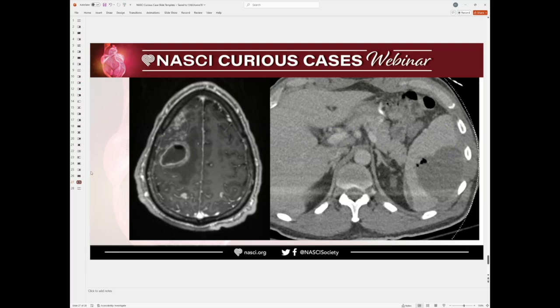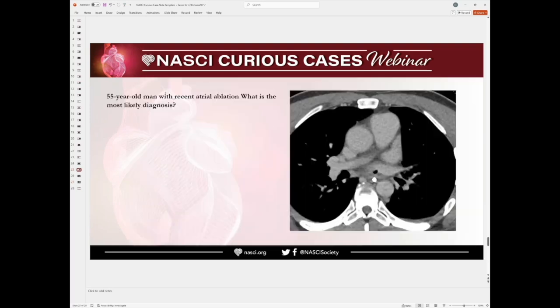Unfortunately, in this case on chest CT, they never gave us any history of ablation or anything. When you dig in, then you start understanding what's going on. But it is so important when you're thinking about atrioesophageal fistulization, especially in ablation cases, or maybe they did some esophageal procedure. Sometimes the findings are very subtle. I have another case, again just one gas bubble within the left atrium. You miss it, you miss the diagnosis, unless they raise the concern clinically. So just a tricky case I wanted to share with you.